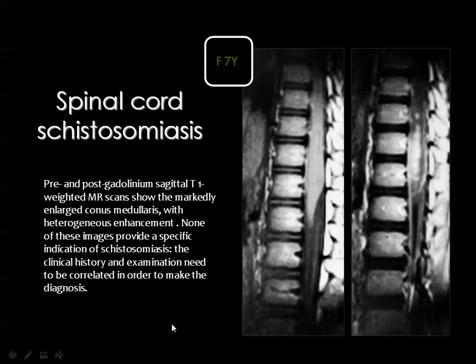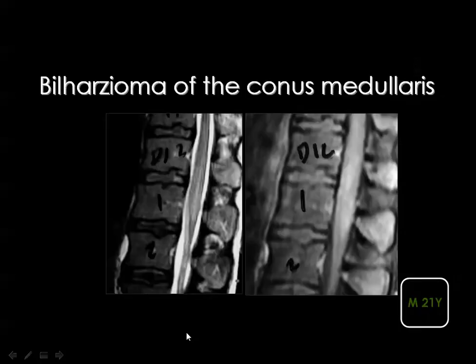But actually, the detection of other bilharzial lesions elsewhere in the body, and the detection of bilharzia ova in samples taken from the conus medullaris is pathognomonic for the diagnosis. This is bilharzioma of the conus.